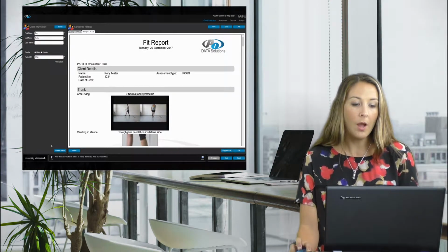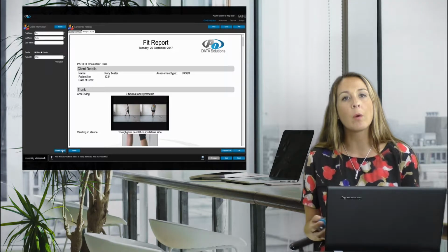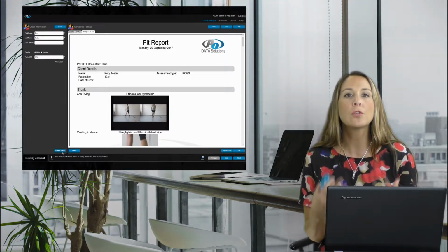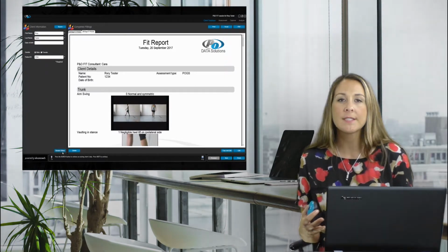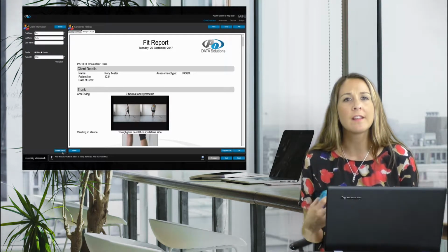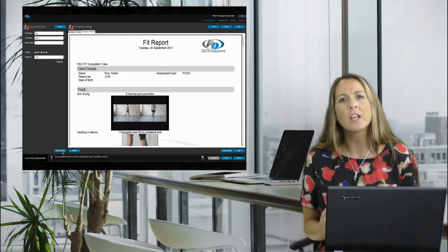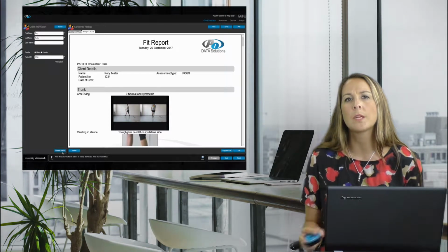We also have a button here called Review Videos. Because the software works as a patient database, when you take video of a patient, all of those patients' files go into one folder, so you can always quickly access any moment in time. So again, they're coming into your office today, they're not feeling very good about the way their socket is fitting, and they feel like they're not walking very well. You can pull up a video from a year ago or 6 months ago and make some comparisons and say, yeah, actually you're right. You're not spending as much time on your prosthesis as you normally do in your steps. So let's take a look and see what we can do about that.